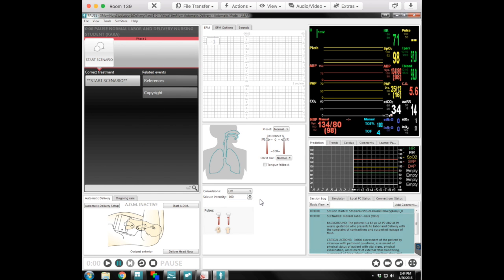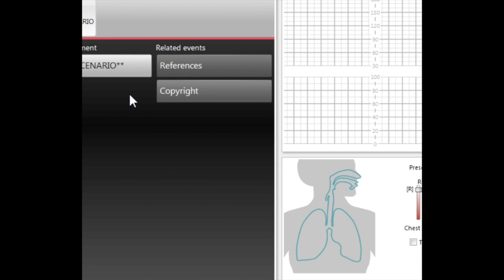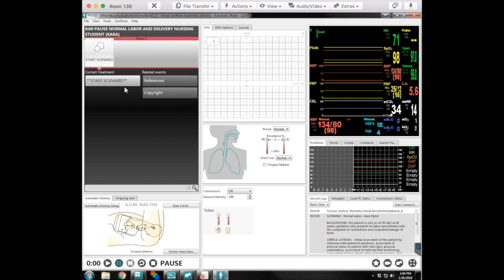And then you've got pretty much what you've been used to if you've run any of the courses in 412 or 422 for MedSurg Fundamentals, MedSurg 2, Lleap. That's the beauty of this software. It all looks the same. So if you're running this for the first time, your primary interest is going to be this area right here. It's just the checklist area. Right now there's nothing there except start scenario. It's a button that you would choose right before you start the scenario.